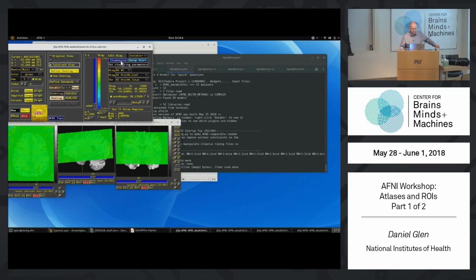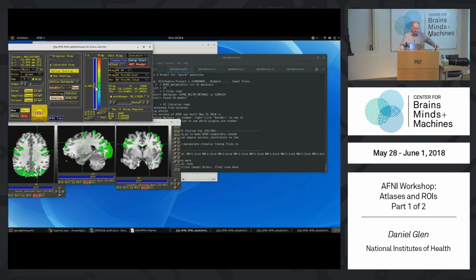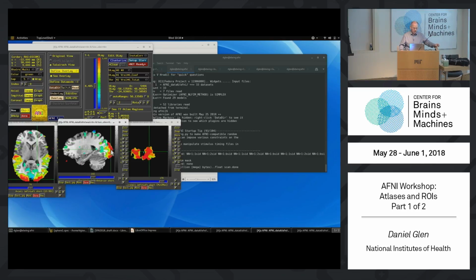You can do this if you like. And I will change my power of 10 slider. I've got the reliable visual coefficient set in my overlay and reliable visual t-stat. And let's say I'll raise this up to something fairly high. And I'll change my range to show about 2% max. Okay, so anywhere I click, I can then right-click in an image viewer and select Where am I?